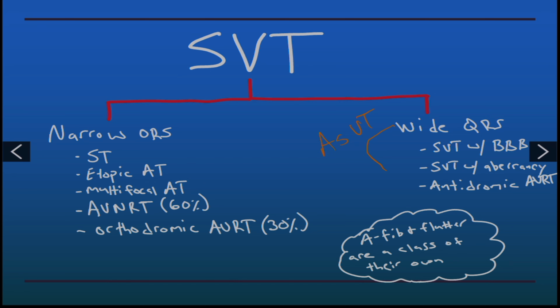In an emergent scenario, it's very difficult for us to distinguish between, is this ventricular tachycardia or is this SVT with aberrancy? In that case, we're going to follow our ACLS guidelines and protocols to stabilize the patient first, and then identify if there's any specific arrhythmia treatment that is warranted.